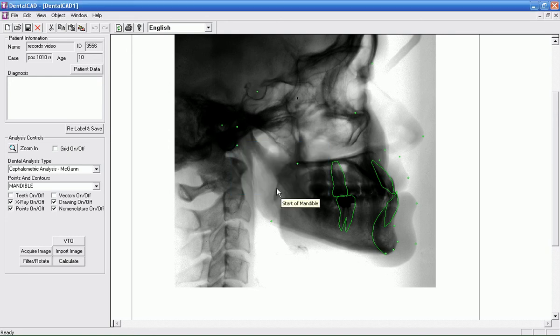Okay, so what's happening here? I go place the current object. Okay. Well, let's start back at symphysis. Let's see what happens here. Oh, okay, now I've got the start of the mandible. B point. Huh. Wonder what's going on there. Okay. Again, don't use that like delete key. Just forget it's even there when you're tracing. Let's see what happens here. I'll go ahead and position. Yeah, I'm very inexperienced at using that delete key. I don't know why I did it in this video.